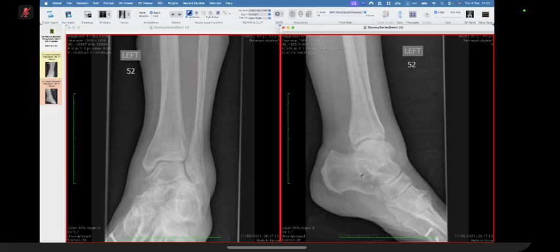Have you looked at the bones properly? We say we look at the bones properly, but we honestly don't look at the bones properly. We sometimes miss important things. And I've given you the history, which is very helpful. Have you looked at the bones properly? Yes, I can see also the tibia, the tibial surface in the tibiofibular joint is seen ill-defined. The cortex is just ill-defined, projectional, and a bit of osteopenia.